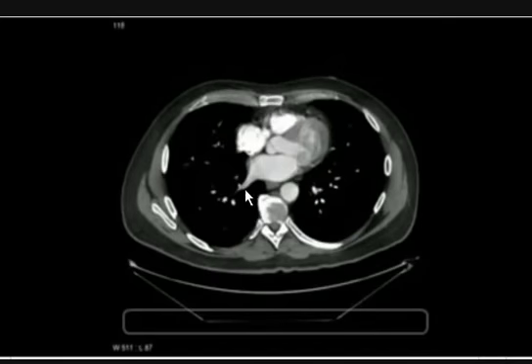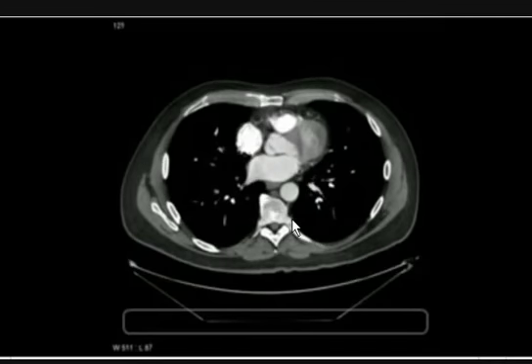So moving up, you can see a pulmonary vein draining oxygenated blood that has got contrast in it, of course, into the left atrium from the right lung here. Aorta, the root of aorta. If you notice, you can actually see the aortic valve here. The pulmonary artery, beginning of pulmonary artery here.